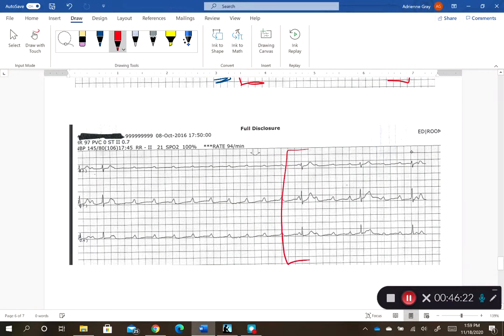So now let's just look at this next section because this is from up there. This is that ventricular standstill that we just saw. All right, I'm going to look at lead 2. I'm going to circle my P waves.